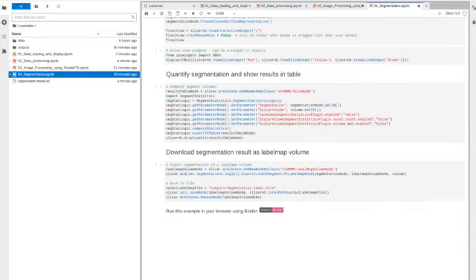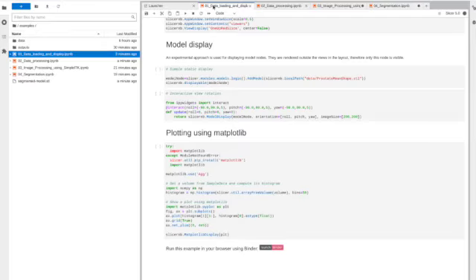Okay. So any questions about that so far? I have a question, Dave. Sure. I just want your confirmation. All of these notebooks are preloaded, right? So you don't have to come up with your own code or learn something from scratch.